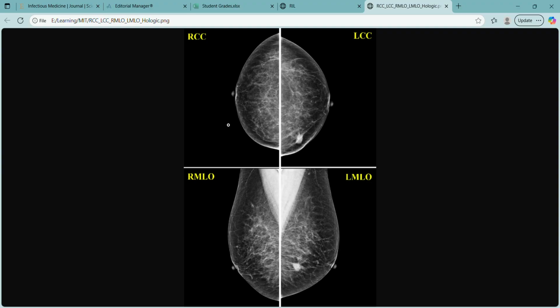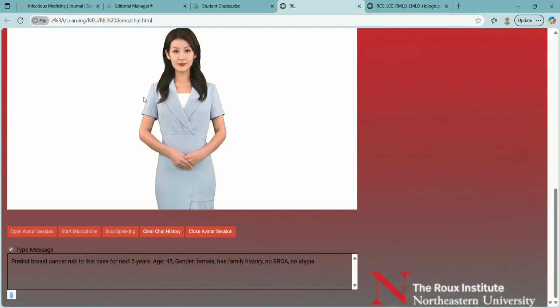Strictly speaking, it's not a regular way that we feed mammograms into the models, but I want to test out the performance with respect to this layout, combining four mammograms together. Also, please ignore the accuracy of the output since I haven't fine-tuned the model seriously yet. Okay, let's get started.